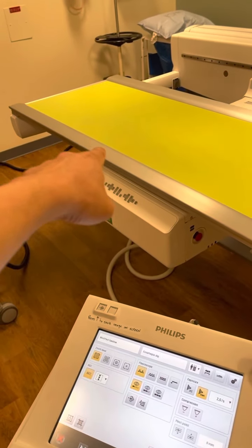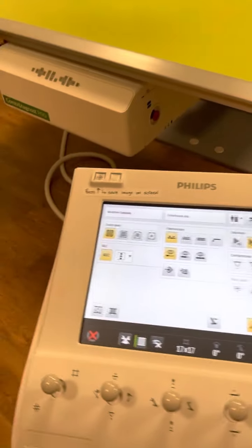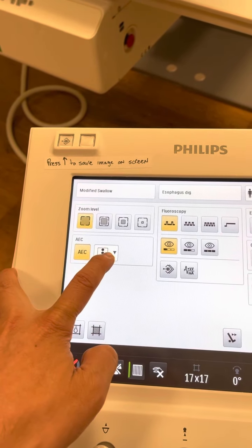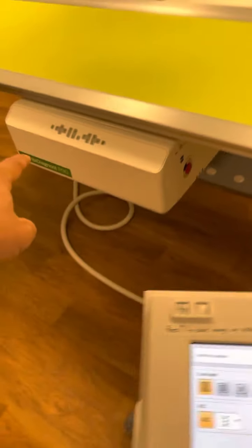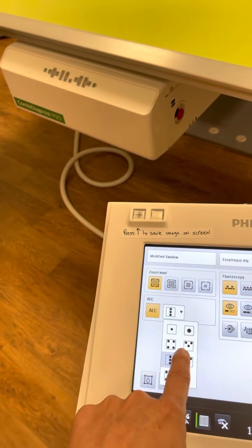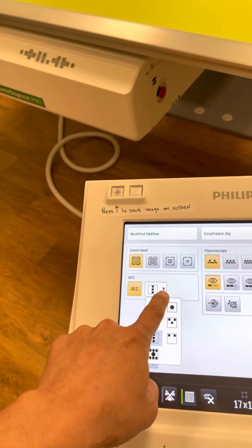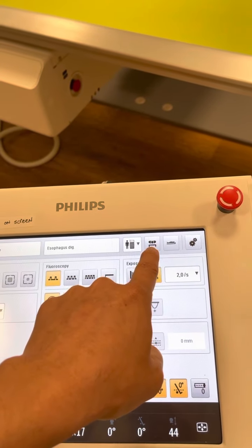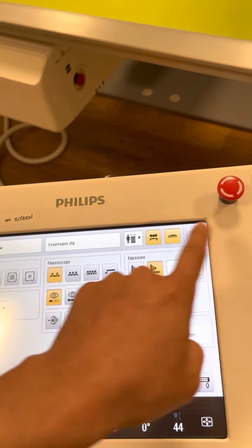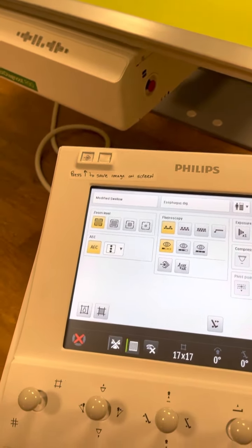Basically the assumption is patient head that way, foot this way, facing up. So this automatic exposure control just shows whatever dot is actively detecting the patient's location, and then does the automatic compensation of X-ray. And if the patient's position is different, you can change it to face down or head this way. So that is the definition of the correct location.